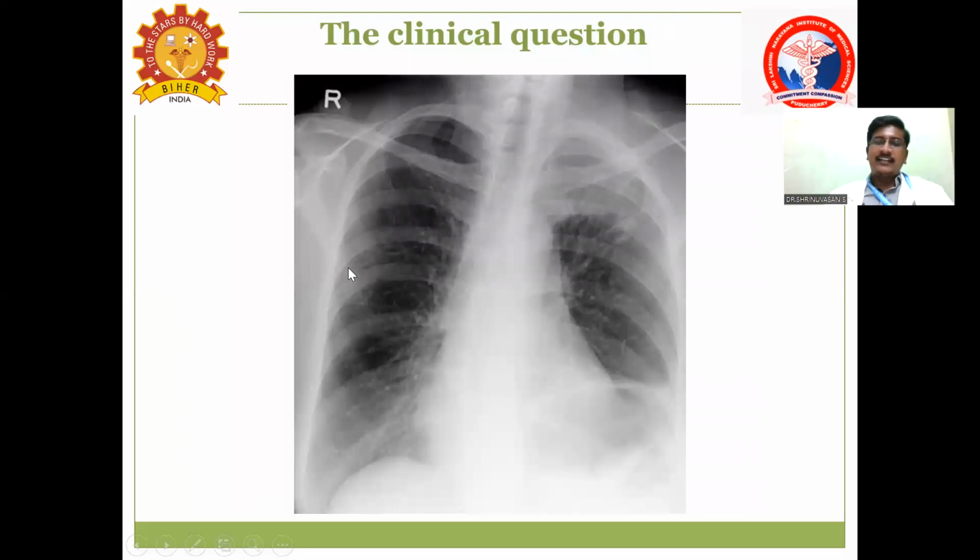So finally, let us discuss one clinical question. Can anyone describe what are all the findings in this X-ray? Yeah.